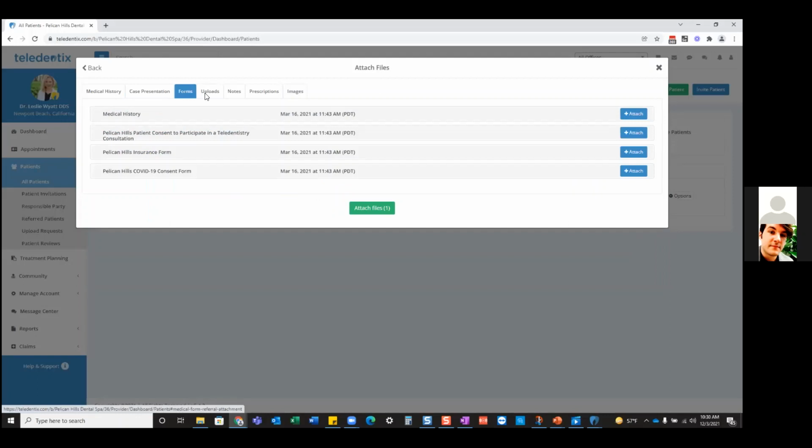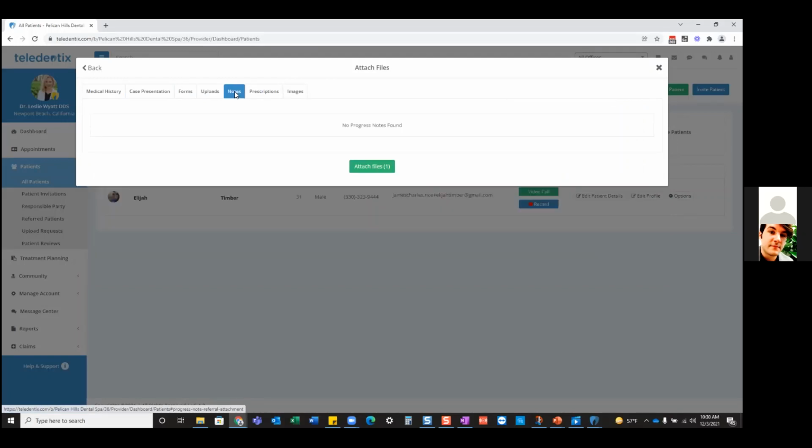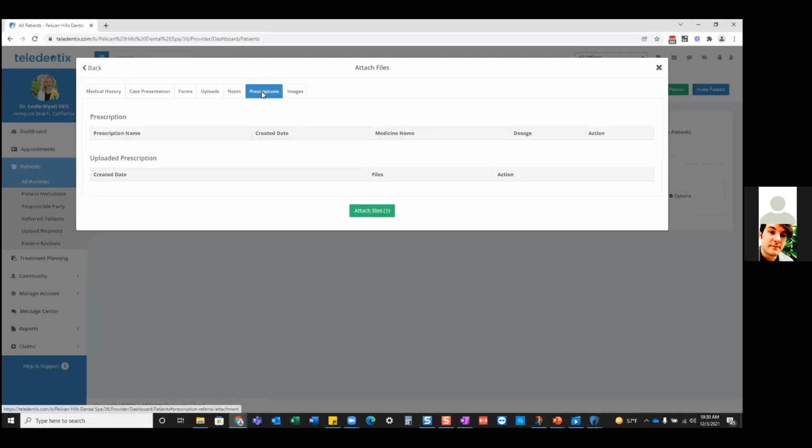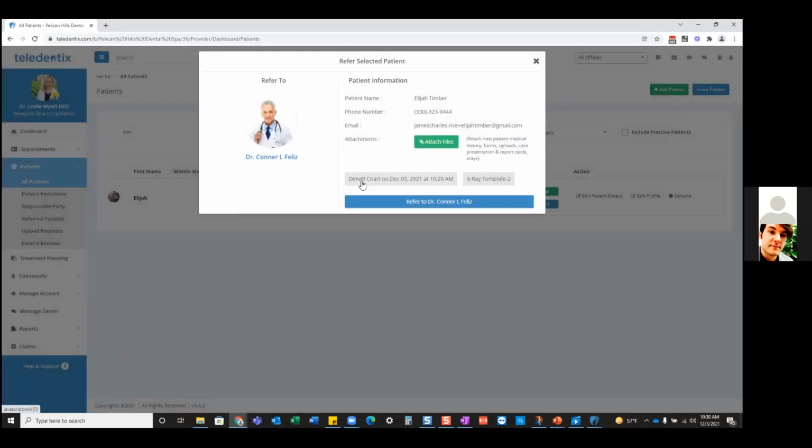Head on over to forms. Maybe this patient filled out a medical form. I can go ahead and attach it. Any uploads, any notes, progress notes, any prescriptions, and any images. So I can go ahead and attach those. Awesome. Going to attach those files.